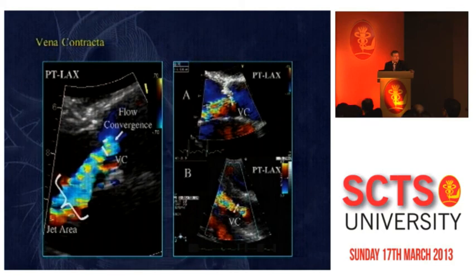There is one situation, however, in which it doesn't work, and it's very important. These are the prolapses of any of the cusps, either in tricuspid configuration or bicuspid configuration. This is a typical example of an anterior cusp prolapse, which is a distal cusp prolapse. You see that there is a bending in the cusp and that the distal part is going below one of these posterior leaflets. This gives a posteriorly oriented jet that goes towards the mitral valve and is impossible to quantitate from the apex like it is usually done. You need to do that from the parasternal view or the transesophageal view like in this example.